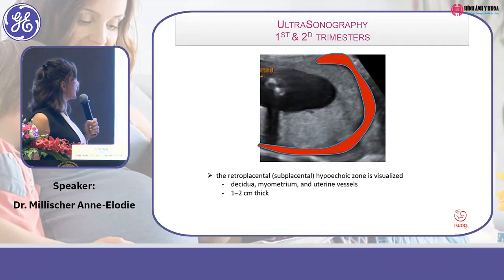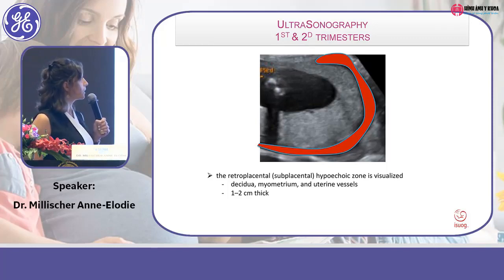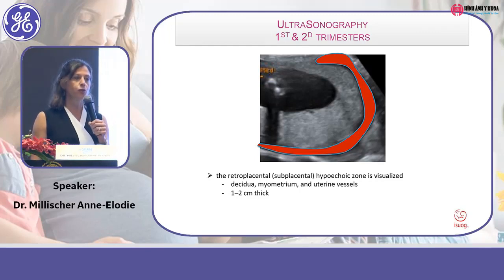And we'll see that the interface between the maternal plate, the maternal side, will be of great importance to better diagnose the morbidly adherent placenta.